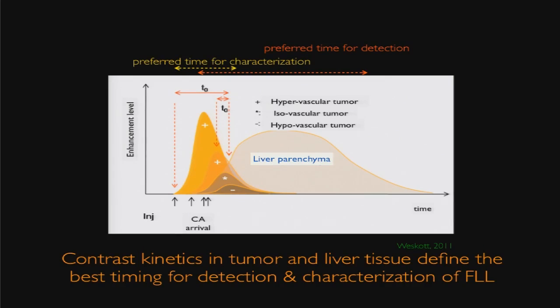And then we have those that wash out very early and have less contrast enhancement over all phases. Due to our high temporal resolution, we can see that for a couple of seconds only. So in CEUS, we see most metastases being hypervascularized.